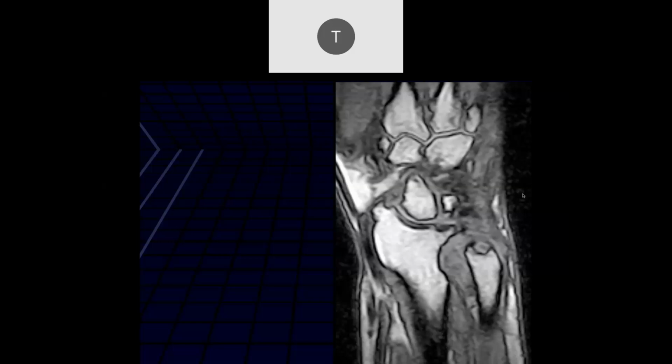All right, there's definitely erosion and remodeling of the distal ulna and the ulnar aspect of the radius. A lot of surrounding synovial thickening. So what do we call this? Ulnar impaction. Well, this would be ulnar impingement. Sorry, impaction would be against the lunate.